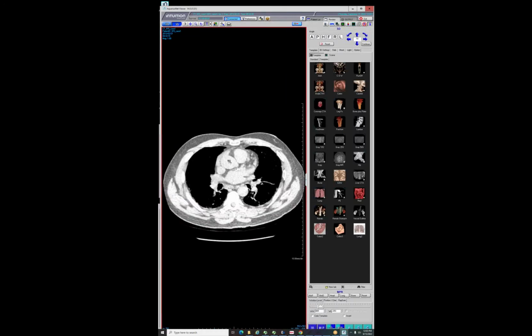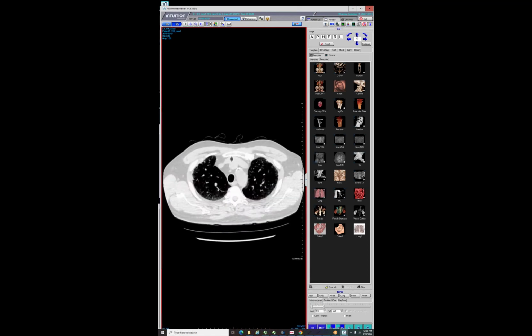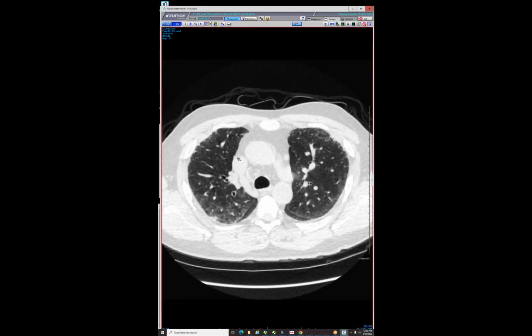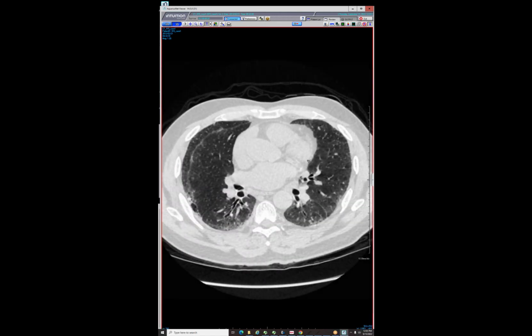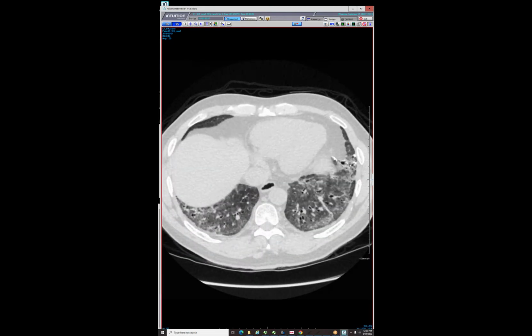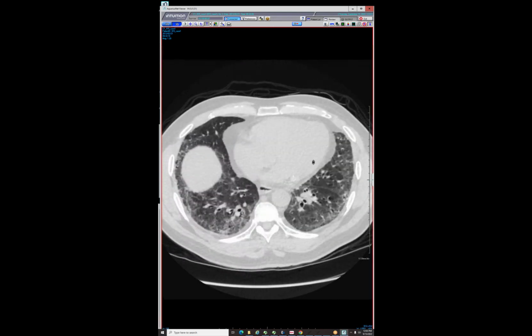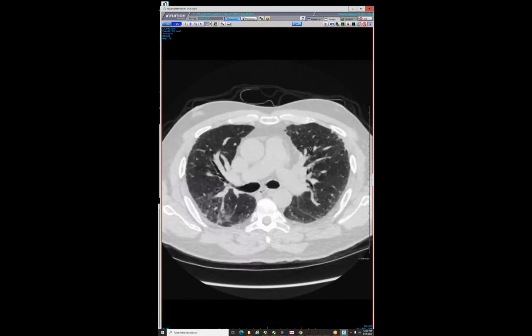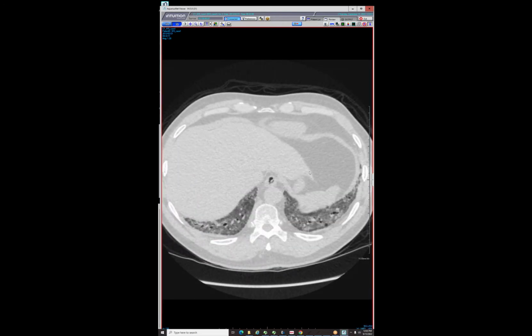more of a differential diagnosis case. Oh no, this is a different case. This is actually quite interesting. And I don't know if I've seen this with path on both sides. So here's a patient that has a pattern of fibrosis. You can see there's surgical biopsy material here. I would say this is pretty darn typical for NSIP. And the patient had a biopsy, and sure enough, it was read out as NSIP.